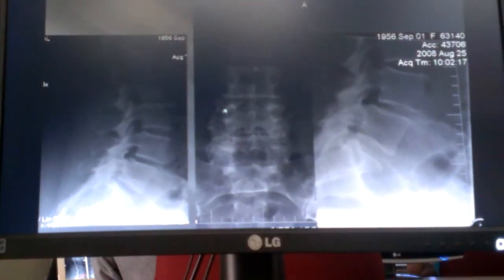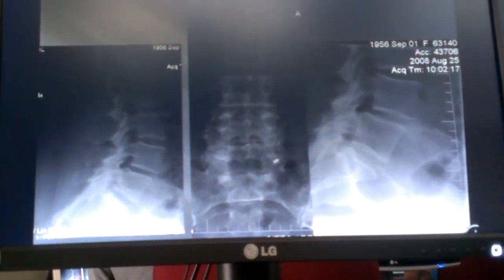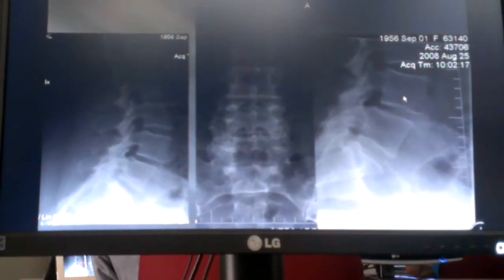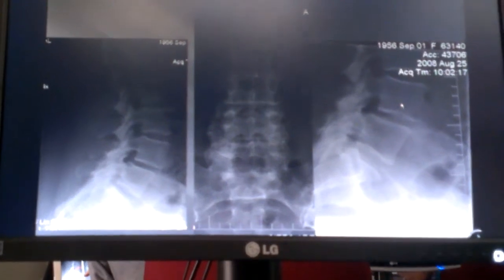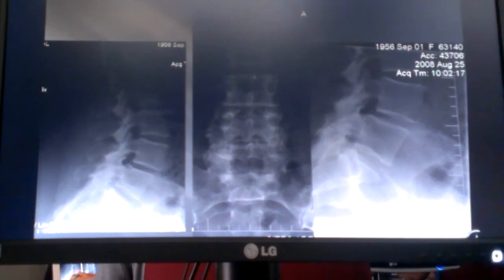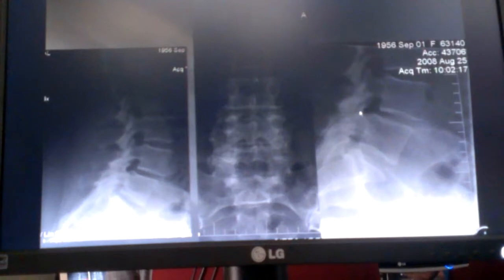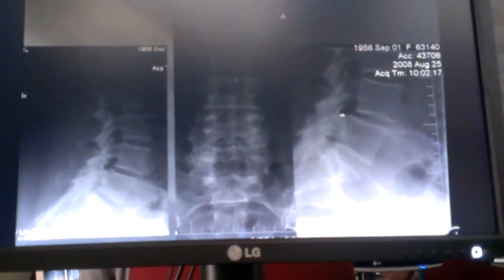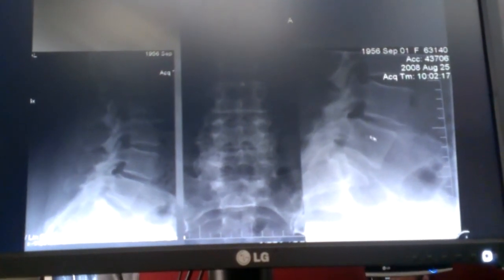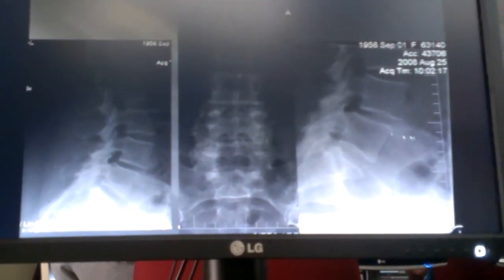And then this is degenerative. There's all kinds of hypertrophic changes that are going around these articulations, both sides. And L4 usually, L4 is the most common, so you need to know that. L4 is the most common for degenerative. L5 is the most common for spondylolytic spondylolisthesis. So you can hypertrophy off the articulations. Sometimes they'll hook back into the articulation of the vertebra that's looking forward, the vertebra below. The superior articular process will hook into that to try and stabilize it.